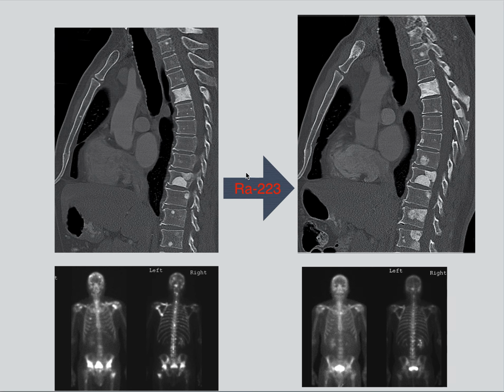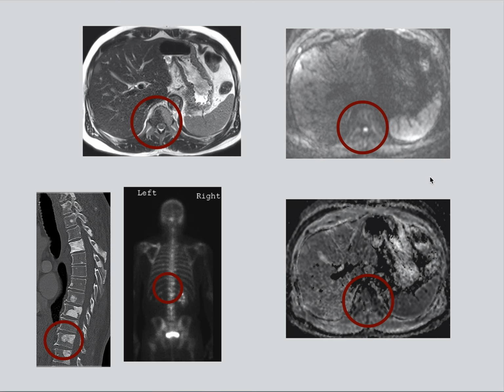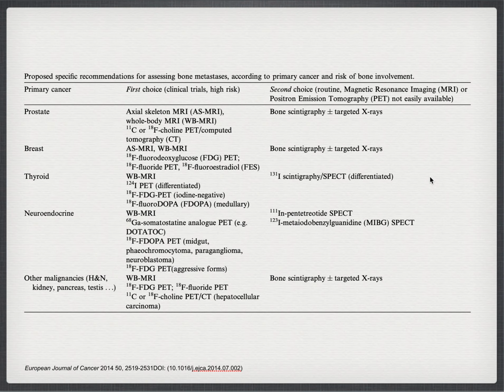What we can see on the CT is pre-treatment, we have really sclerotic lesions and somewhat sclerotic lesions, and post-treatment, what was slightly sclerotic is becoming more sclerotic as it's healing, and paradoxically, we can actually see decreasing tracer uptake despite increasing sclerosis on CT scan. On the same patient, MRI confirms absence of restricted diffusion in this lesion, so consistent with treatment response.